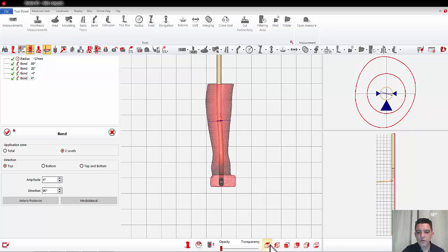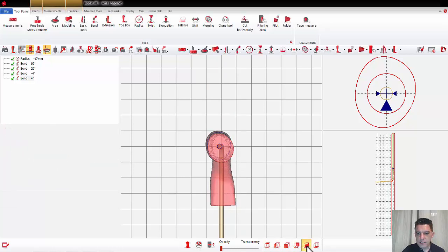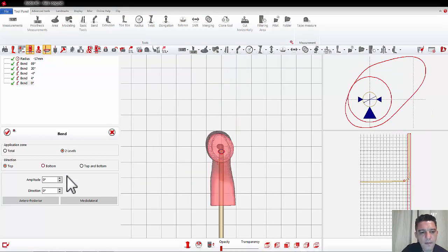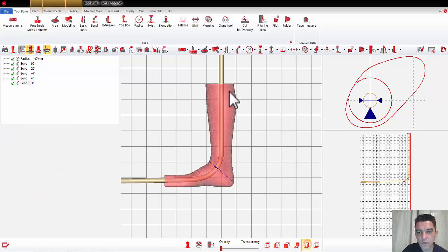Something like this. And after, if you want to see from the top and you want to move a little bit to the medial, in this case I prefer to start with the lateral view, to put two levels approximately on the ankle, 1 and 2, and after is the bottom part. In this case is mediolateral. You can turn like this. Okay, so now everything is okay. We want to convert this scan in a new Rodin 4D form with the same axis I prepare.